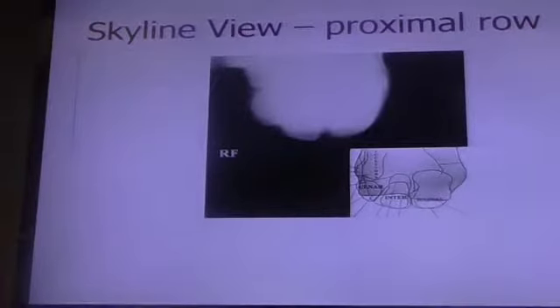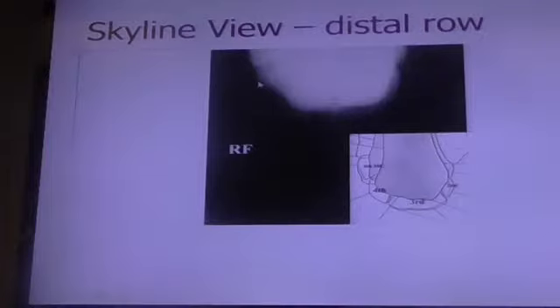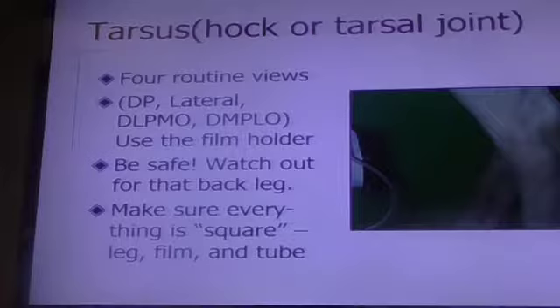And that's just another example of what it looks like. Radial carpal bone, intermediate, and then ulnar carpal. Distal row, see the articulation is laterally placed. Third carpal bone curves in front of dorsal to the limb. In the tarsus, it's exactly the same concept.